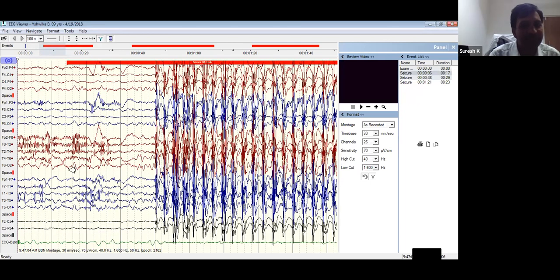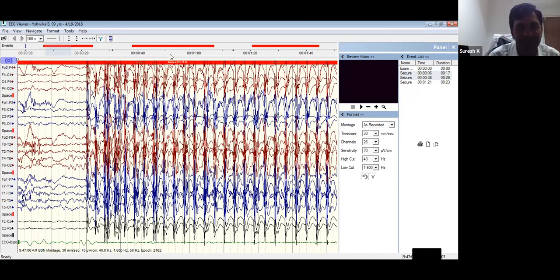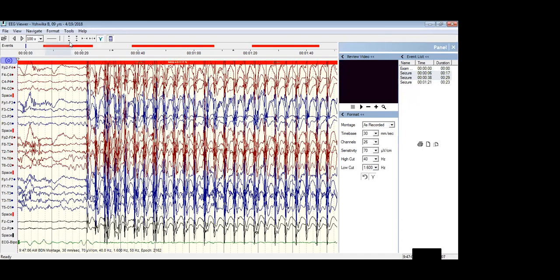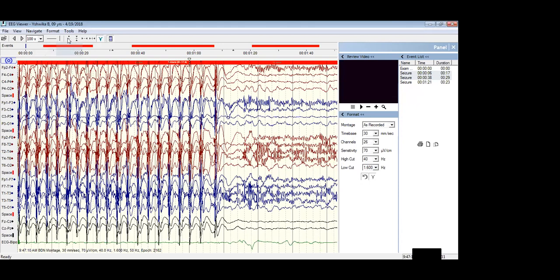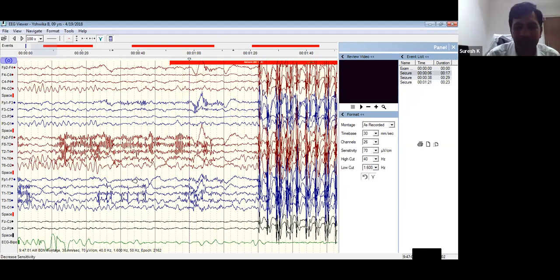You are seeing something. Now, what change do you want me to make in the montage? I want the sensitivity decreased. Okay.